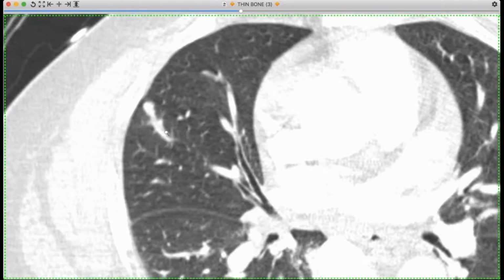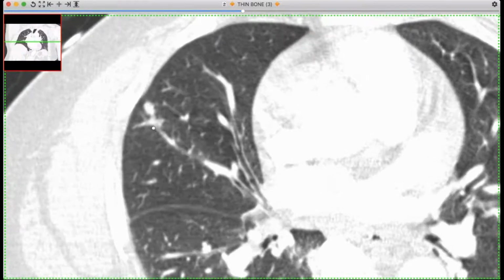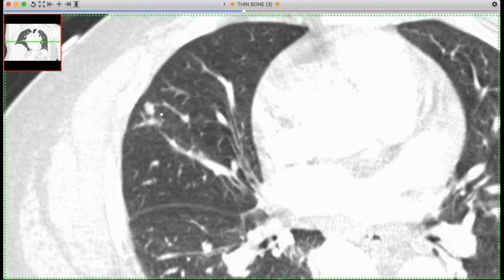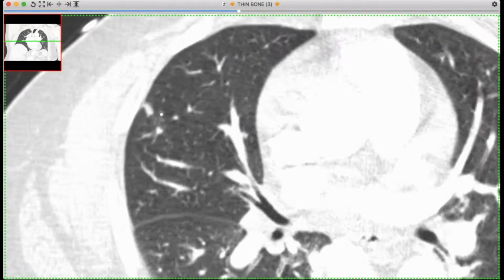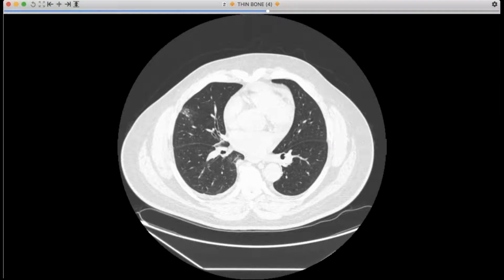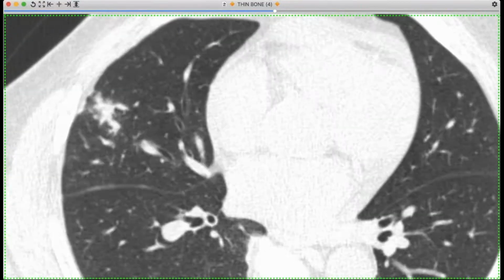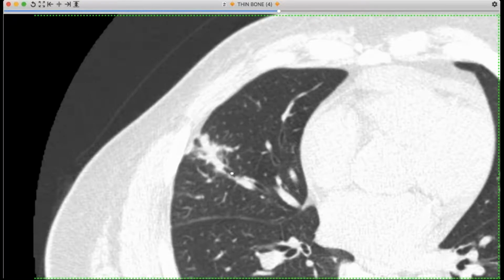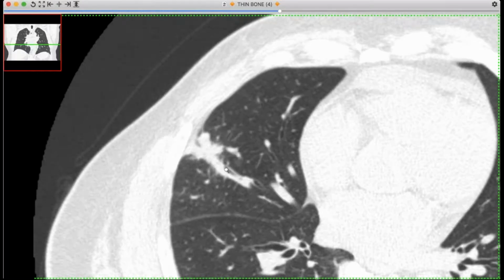But we see endobronchial stuff all the time. I did point out that the vessels in the vicinity were a little dilated, which I think in retrospect is appreciated. But going prospectively, that would be a very hard observation to make and distinguish from airway dilation. And if we look at the first surveillance scan done a few months later when it started to grow, you follow that airway in, but the airway almost fades into it.